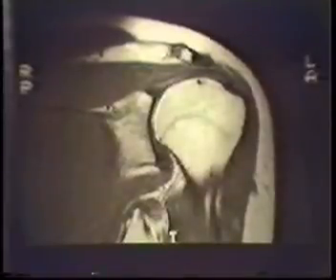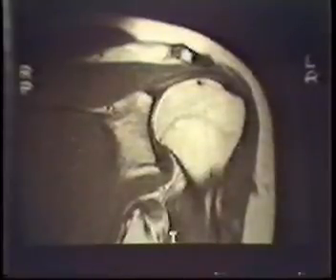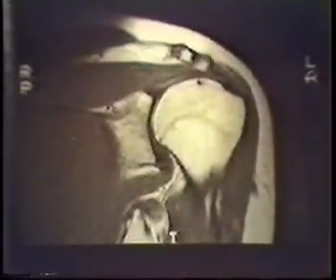Now, in evaluating the shoulder, I like to use a concept which I think might be right, but I'm not entirely sure it is. And that is that the disease of the shoulder that we're interested in is basically rotator cuffs. But rotator cuff injuries, the majority, start out as impingement. And the impingement is normally due to one of two factors. Either an acromion that rides too low, like we're seeing here. There's very little space between the acromion and the humeral head, and that's because the acromion is too low.